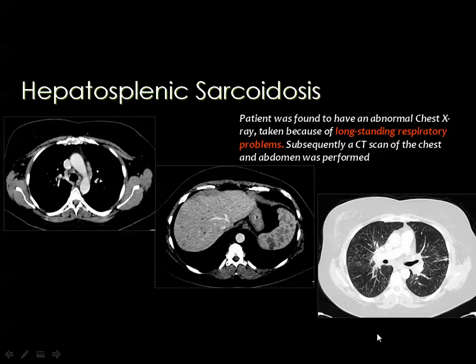The scans of the chest show the presence of interstitial opacities as well as minute nodules, and the mediastinal window shows the presence of slightly enlarged lymph nodes in the prevascular area as well as posterior to the superior vena cava.